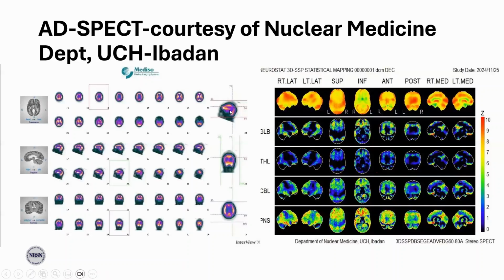So this area on this sagittal image, you see paucity of color coding in this parieto-temporal or parieto-occipital region. Now, in the inferior image or the lower image here, you can appreciate some subtle frontal hypoperfusion bilaterally, but it's to a lesser degree than what is seen in the posterior parieto-temporal regions. Now, this just tells you an idea of perfusion.